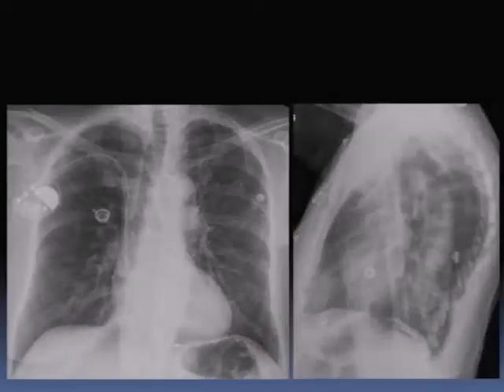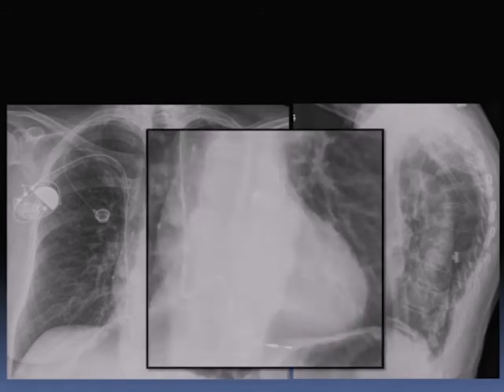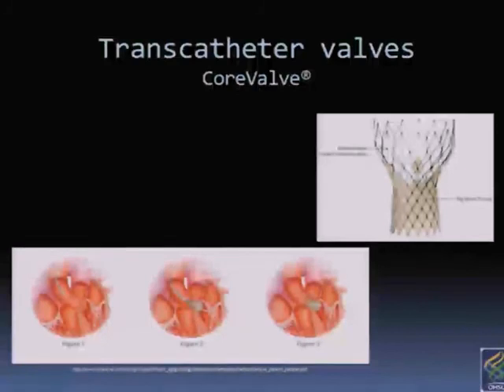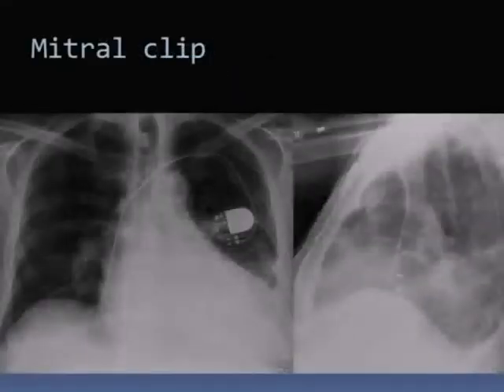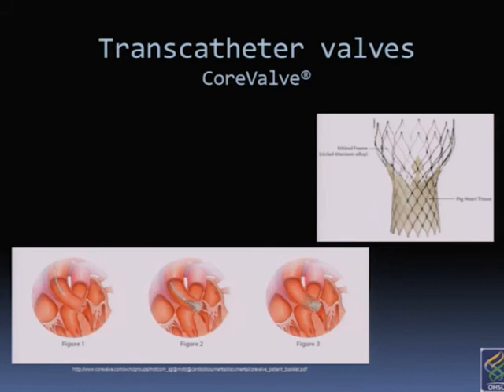The other transcatheter aortic valve is the Medtronic CoreValve, which has a completely different footprint because it is a self-expandable nitinol stent in which porcine pericardium is embedded, and it is exclusively placed via a transfemoral approach. The centering or the positioning of the valve is centered within the sinus of Valsalva, so it covers a much bigger footprint and a much bigger area than the Edwards Sapien, which is anchored right in the aortic annulus.